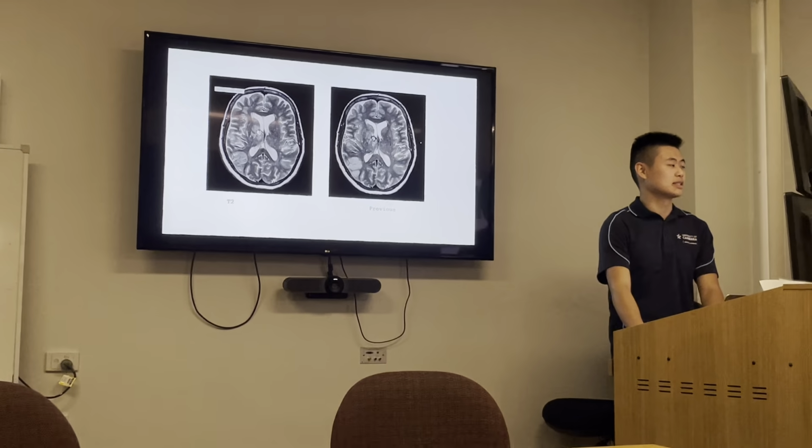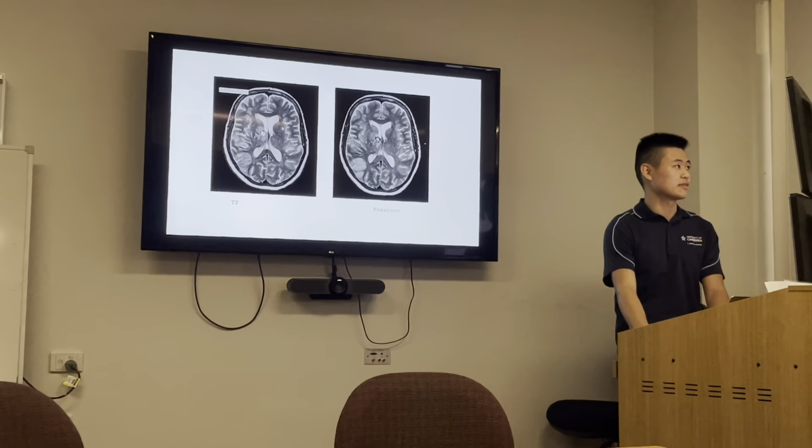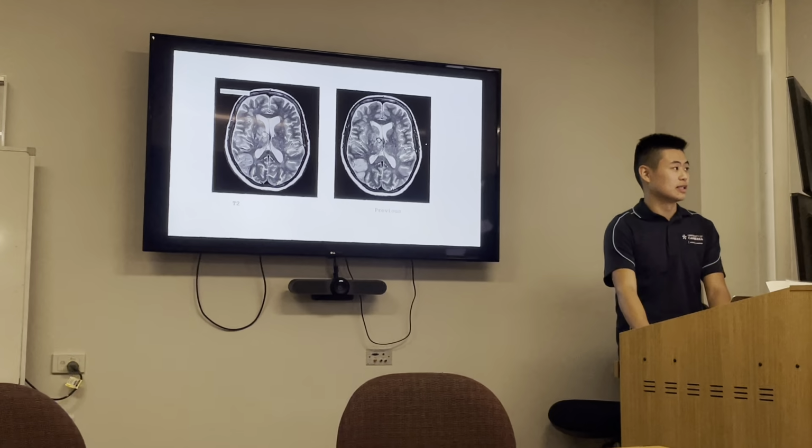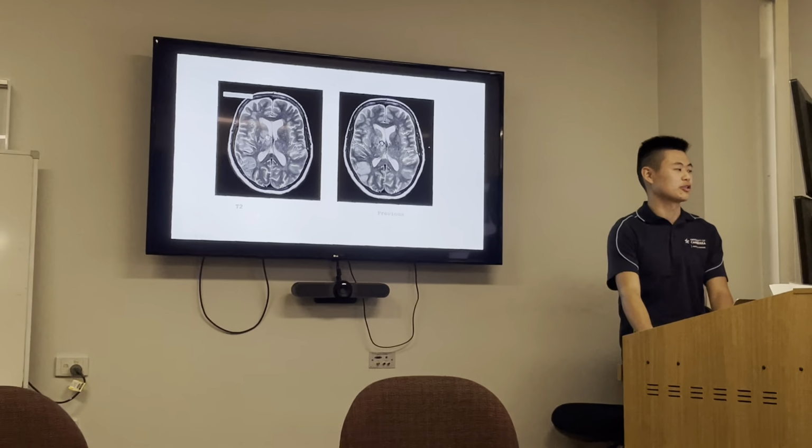So you can see the CSF is hyperintense over here, relative to the matter over here. And once again, that's just catheter. And you can see that the lesion does show a bit more on the T2 over the T1.